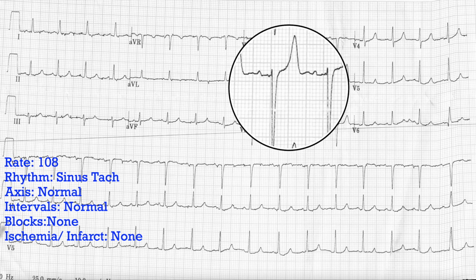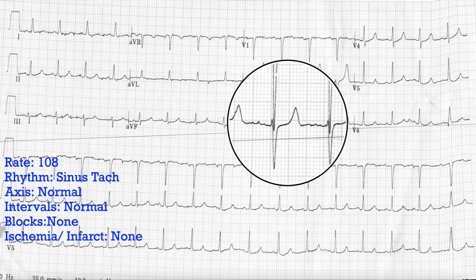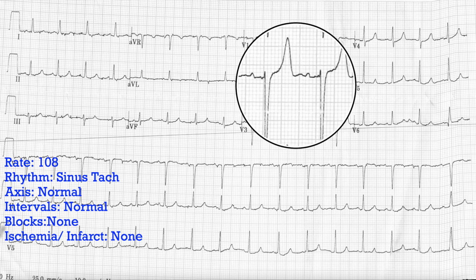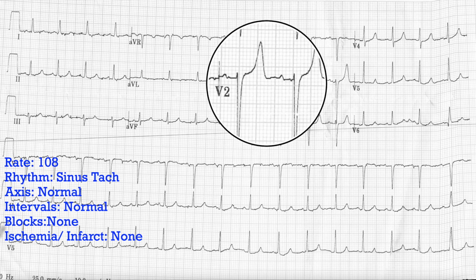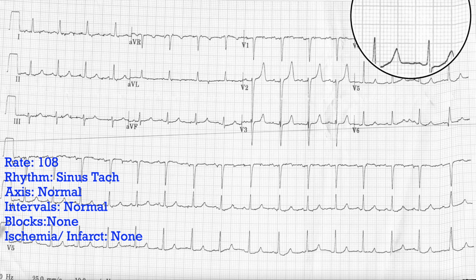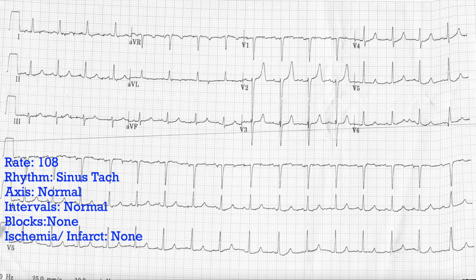We think about T waves being big in two cases that should jump to your mind. One would be a hyperacute T wave, i.e. the early sign of a STEMI before you really develop the ST changes with it. And the other is hyperkalemia. This doesn't look like a hyperacute T wave to me. This looks pointy and more narrow than I'd like to see with a hyperacute T wave. Usually a hyperacute T wave is this big fat thing. These narrow little pointy T waves like that one, and even that one, even though it's not so tall, it's very pointy. That is indicative of hyperkalemia.